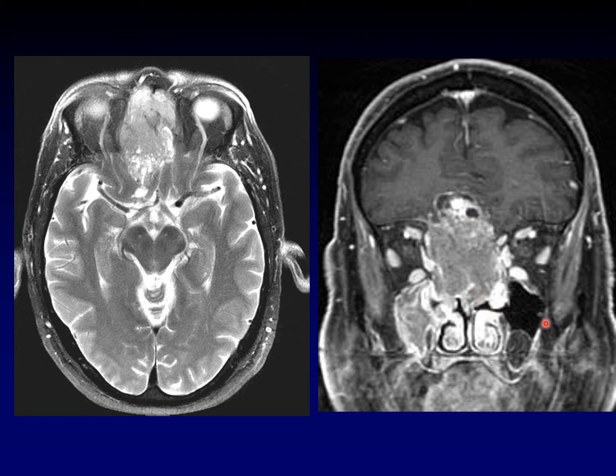That is a clue that what we're dealing with here is esthesioneuroblastoma. Anytime you see an aggressive mass in the anterior skull base that has traversed the bone of the skull base to be both intracranial and intranasal, you should always think about esthesioneuroblastoma. Certainly other aggressive masses like squamous cell carcinoma and melanoma can do that in this location, but the classic lesion to do this is esthesioneuroblastoma, and the small cysts along the cranial surface are essentially pathognomonic.